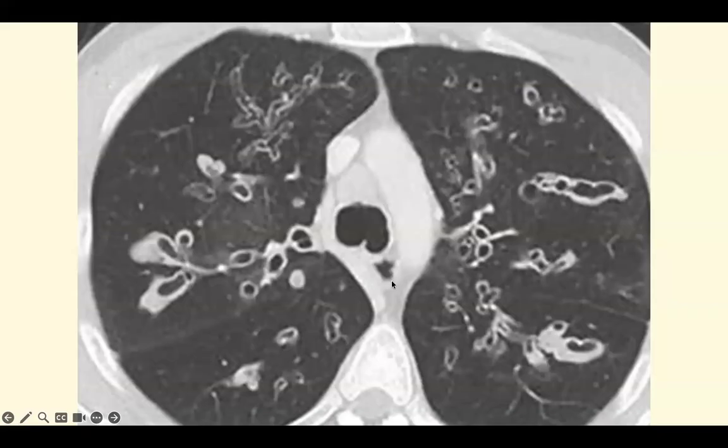There was a question. So it's loss of tapering. Yes, this is, in my opinion, the only sign for sure of bronchiectasis, because the signet ring has pitfalls. The signet ring doesn't mean there is true bronchiectasis. Don't use the tram track sign or the signet ring sign. They were originally established in X-rays. It was helpful there, but in CT you can see the course of each bronchus and assess if they are tapering or not. Good question, Dr. Nikos.